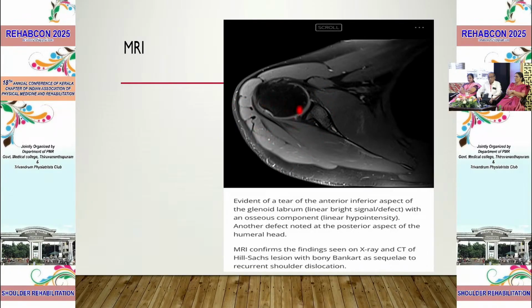It's an axial image. Now you have to be well versed with the axial, coronal and sagittal. Whenever people send you films, you can place the films and look into them. You can put up the coronals, axials. Sometimes they may be given separately, sometimes the axial will be all given in one film. You have to look very carefully to identify the axial, coronal and sagittal.